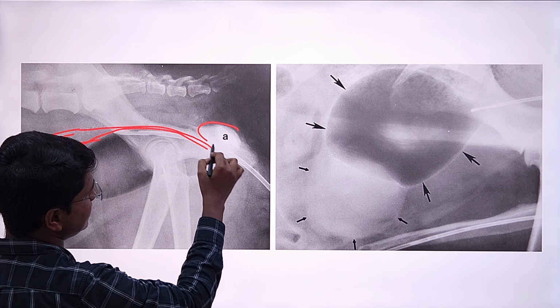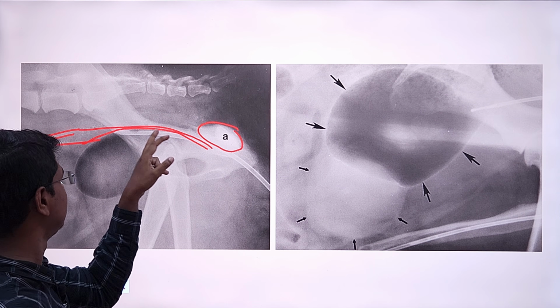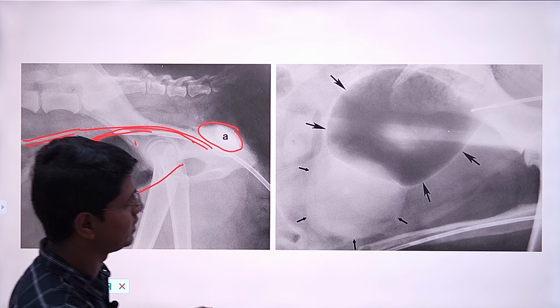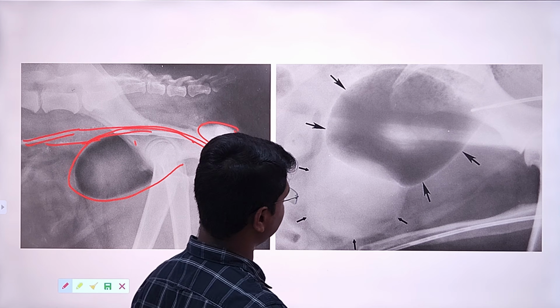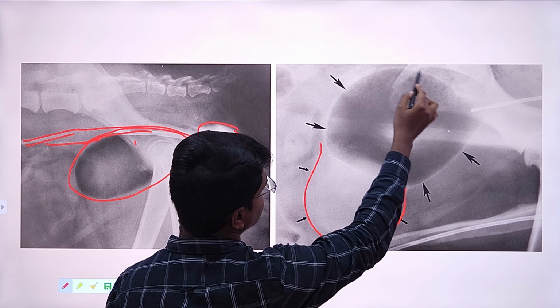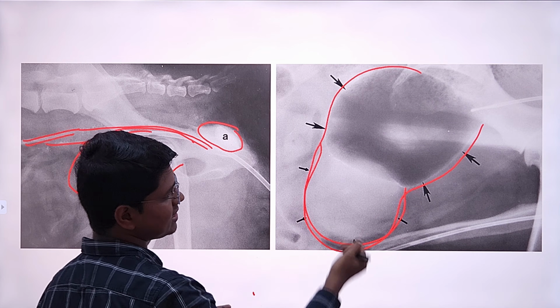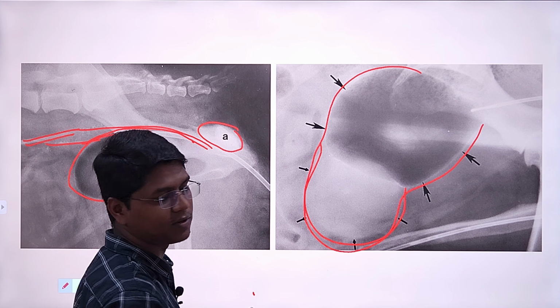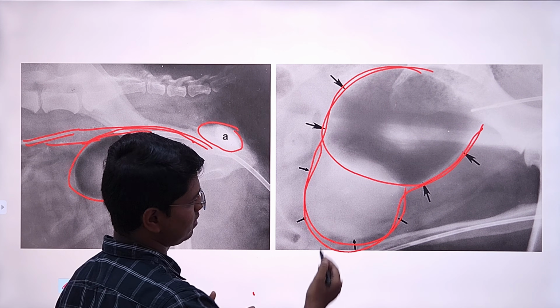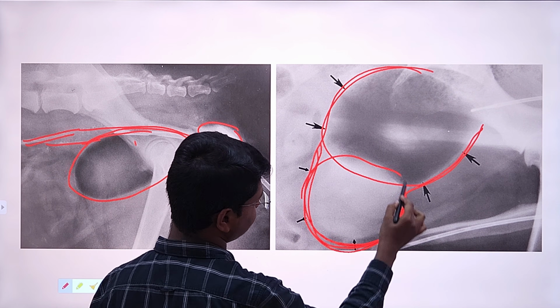Okay, here the contrast agent is in the vagina of the female animal. This is a case of ectopic ureter. This is the entire bladder. Here you see this is a bladder tumor, maybe a carcinoma or something. See, this entire thing is bladder actually. This is abnormal shape. When the contrast agent has been pushed, here negative contrast, only this portion is highlighted or visible, but this is not taking the contrast. So there might be some pathology.